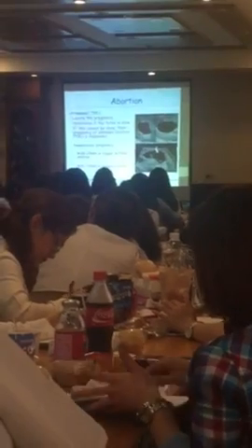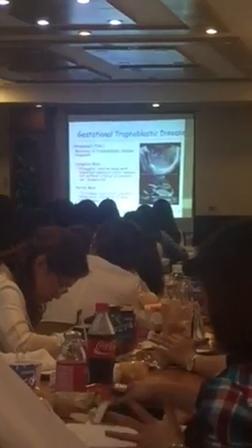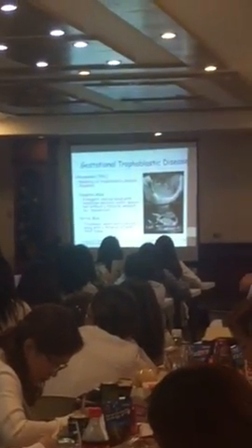So another differential diagnosis for a patient with amenorrhea and vaginal bleeding is GTD. Okay? So you have already four: intrauterine, threatened, then you have ectopic, and you have GTD. So the mainstay of the diagnosis is still ultrasound. And what you need to understand is just to differentiate if this is complete or partial mole. The presence of placenta means partial. The presence of an embryo, placenta, and a snowstorm pattern is still partial. If it is a snowstorm pattern alone, then that will be complete.